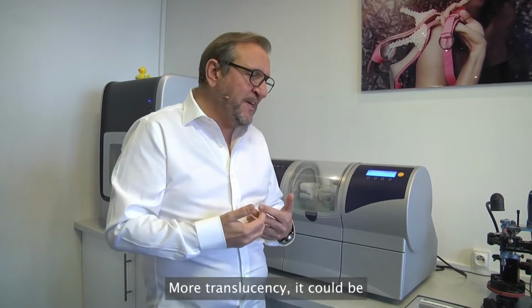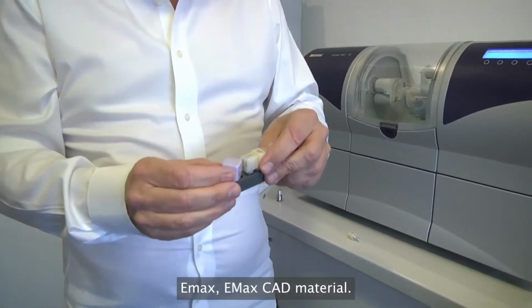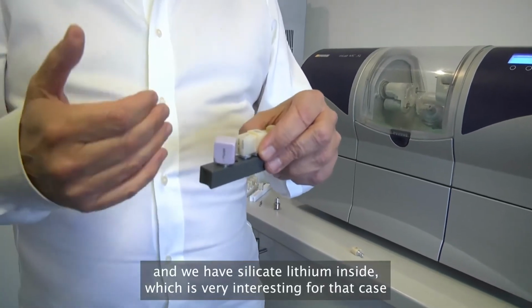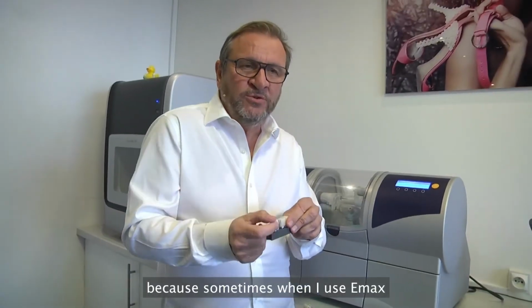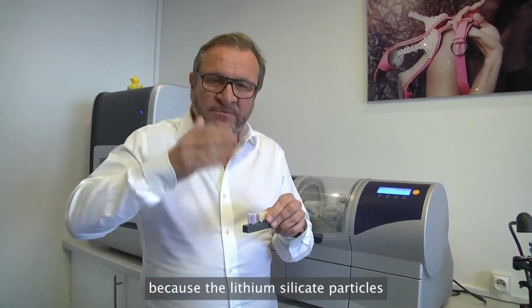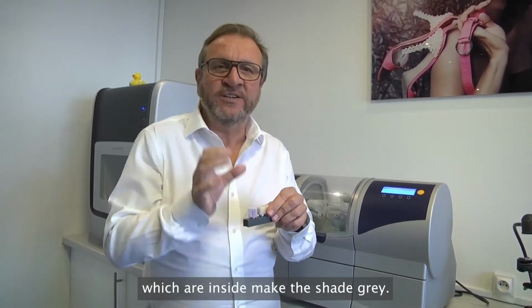More translucent, it could be something like Emax CAD material. So it has to be crystallized. And we have lithium silicate inside, which is very interesting for that case because sometimes when I use an Emax block, I have some gray effect on it because the lithium silicate particles inside make the shade gray.